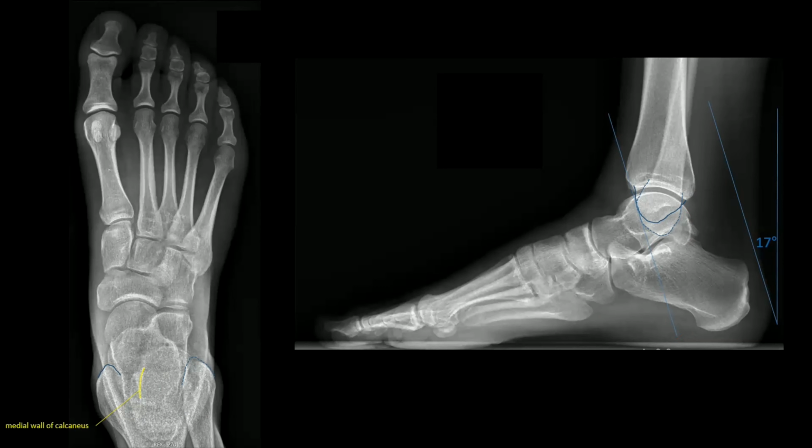If the foot was positioned correctly during the acquisition of the lateral radiograph, then the anterior borders of both malleoli are aligned. On the dorsoplantar radiograph, the anterior borders of the malleoli define the slope of the line running parallel to the X-ray beam of the lateral radiograph.